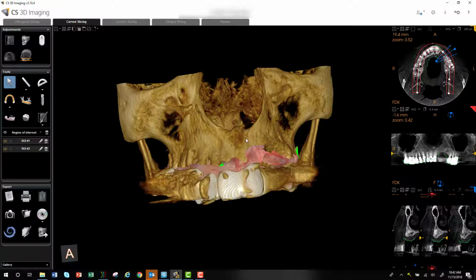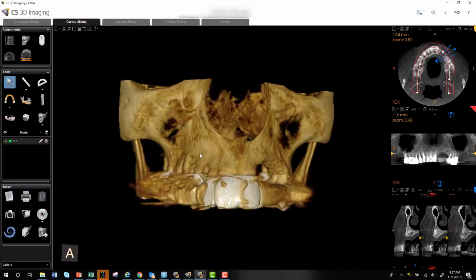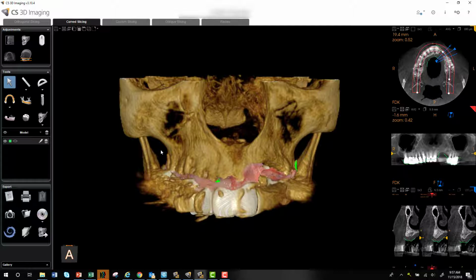Anyway, so we can see here all the scatter off of that CBCT, and if I toggle the 3600 on and off, you can really barely see it. And if you're trying to create images for patient presentations or for putting into a PowerPoint for lectures, study clubs, sending to referring doctors, it's not a great image.